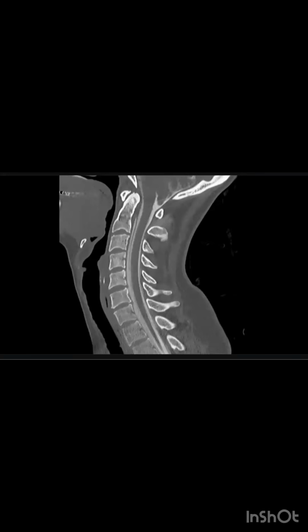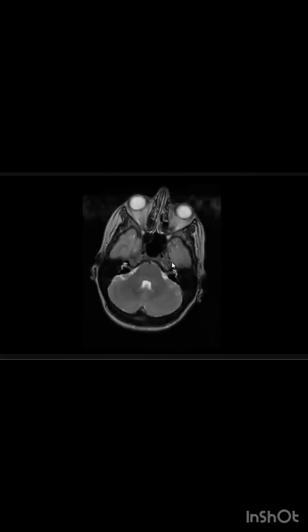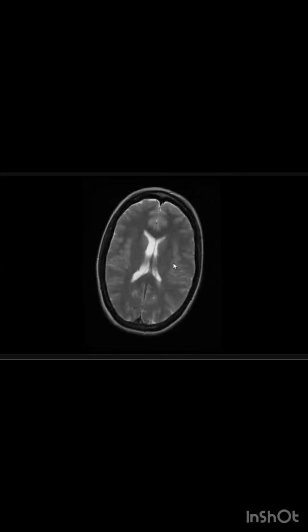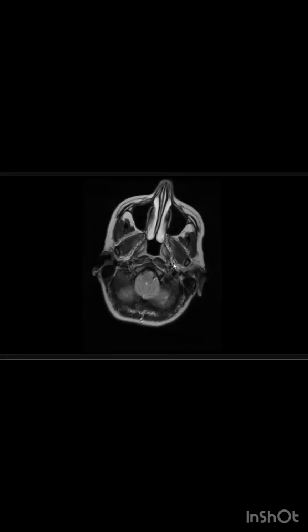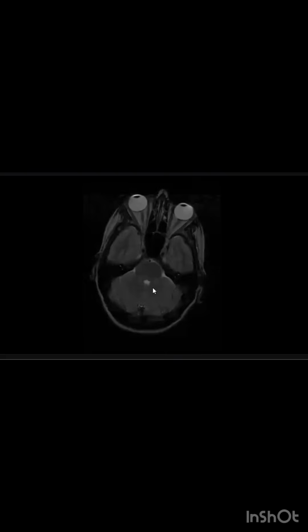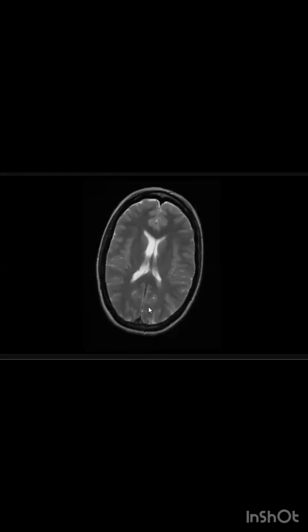Next one. You did well because you suspected intracranial hypotension, because you went for the check areas. Here the clue is foramen magnum crowding. Here the venous sinus is convex, which means it is engorged. And if you look at the internal cerebral veins, they are also engorged.